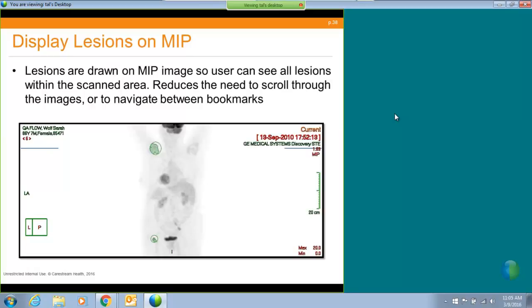What we are doing specifically for threshold segmentation is allowing it to be shown on the MIP image. So we can see it here. It wouldn't show the maximal SUV values and the name, because the PET image already shows that. It only shows the segmentation itself and the outer rim, the outer sphere of that segmentation. And as the MIP swivels around, you can see its changes.